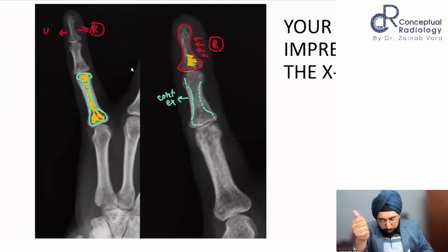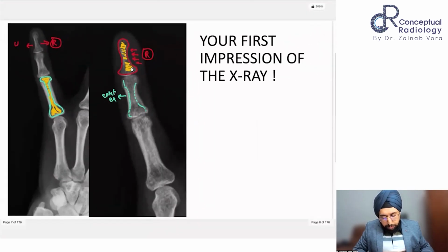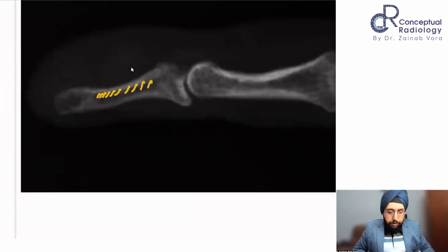medullary cavity is absolutely normal. There is no lytic lesion which you see. Okay? There is just a smooth, kind of a smooth concave impression on the radial aspect of the distal phalanx, along with significant thinning of the cortex at the level of the shaft of the distal phalanx. Okay. So the lateral view confirms that there is no lytic lesion as such.